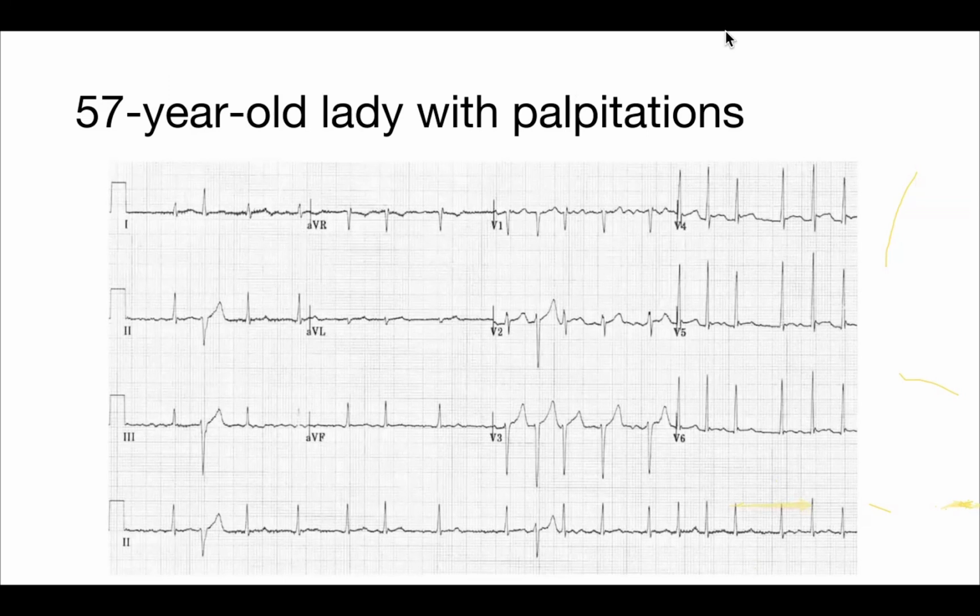So, 57-year-old lady with palpitations. This is just additional knowledge. I don't think they will ask this. Now here you might miss. Now this is again, what is the rhythm here?